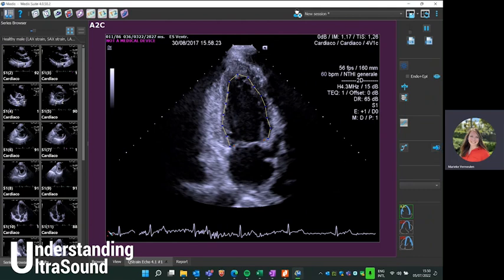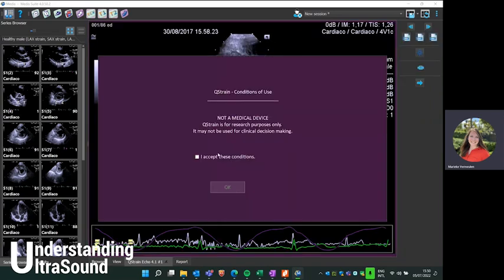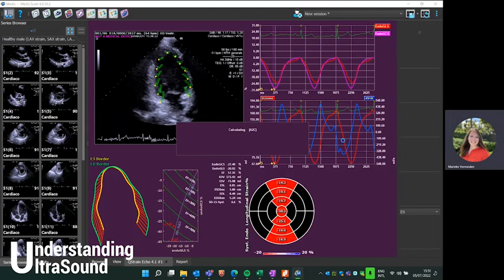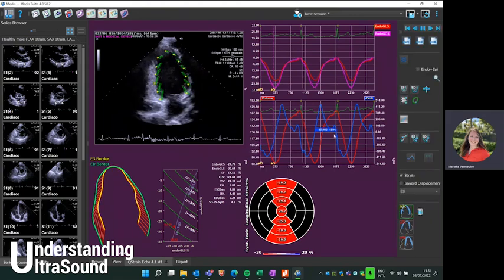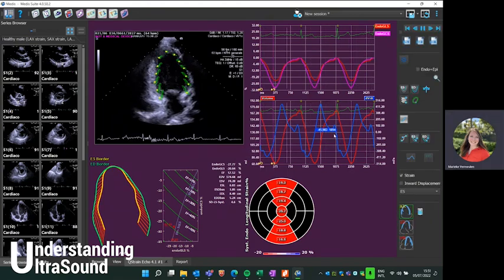If you're satisfied, you can continue your analysis, and then the algorithm will determine a delineation for the end diastolic phase, but still you have the option as a user to make some minor changes. If we then continue our analysis, we can see that we are already giving a lot of strain results. If we want to have a full analysis, so that means a completely filled in bullseye plot and also a 3D model, we will need to repeat this process for the 3 and 4-chamber view.